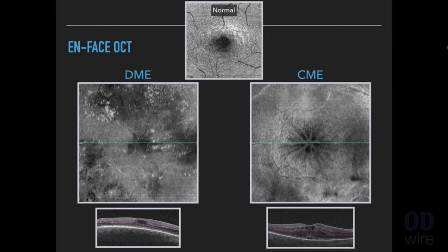This is a way that you could use your current existing technology, your OCT device that's in your office right now. You could look at the images en face, and instead of just looking at them in these qualitative, cross-sectional images, or perhaps quantitative maps, which are not on this slide, you could look at them en face, as you see here and here, and that perhaps could provide an entirely different perspective and maybe assist with diagnostic accuracy. So looking at the technology in a different way is important. You've got this in your office right now.